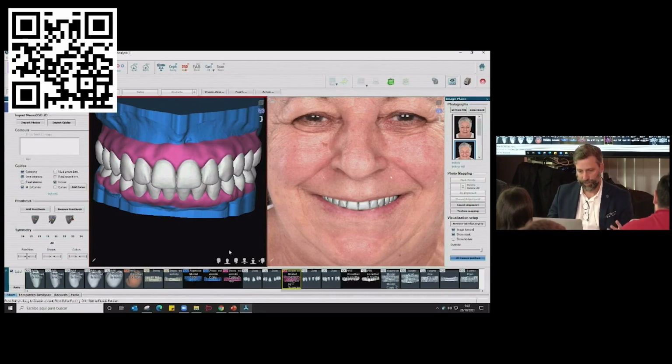And on the lower arch, we bring also the design to the CBCT, and we confirm the teeth are out, so we plan the implants. Okay, it's very important at this stage to at least show all the simulations to the patient. So that's what we send with the presentation, the interdisciplinary one. We send the design and we send the simulations also. So you can explain to the patient the need of implants, why those teeth are not worth keeping. Then you show the simulation of the implant so the patient understands, and then you explain the treatment, sell the treatment, the patient agrees, and then you start the treatment, right?